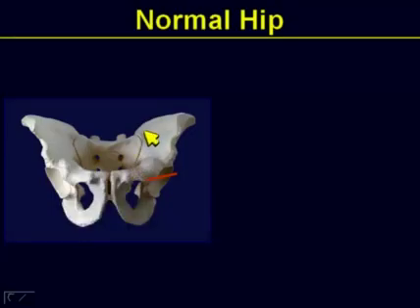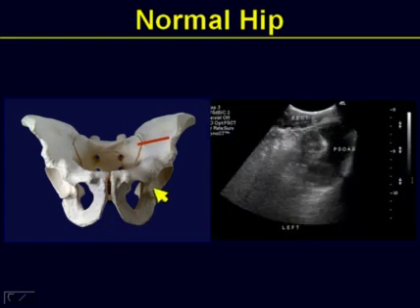The normal hip, as you can see here in a representation of the pelvis in AP view, you could now appreciate the fact that you have to go from a level of the acetabulum into the iliac fossa. This is important because of the proximity and contiguity of the hip into the iliac fossa. Case in point, for example, everybody knows that the iliopsoas bursa can itself ascend into the ipsilateral iliac fossa.